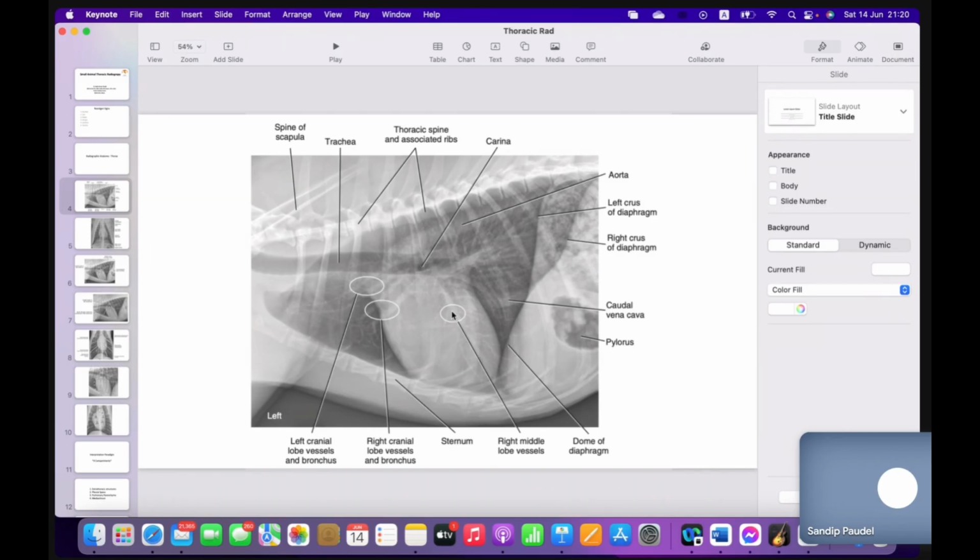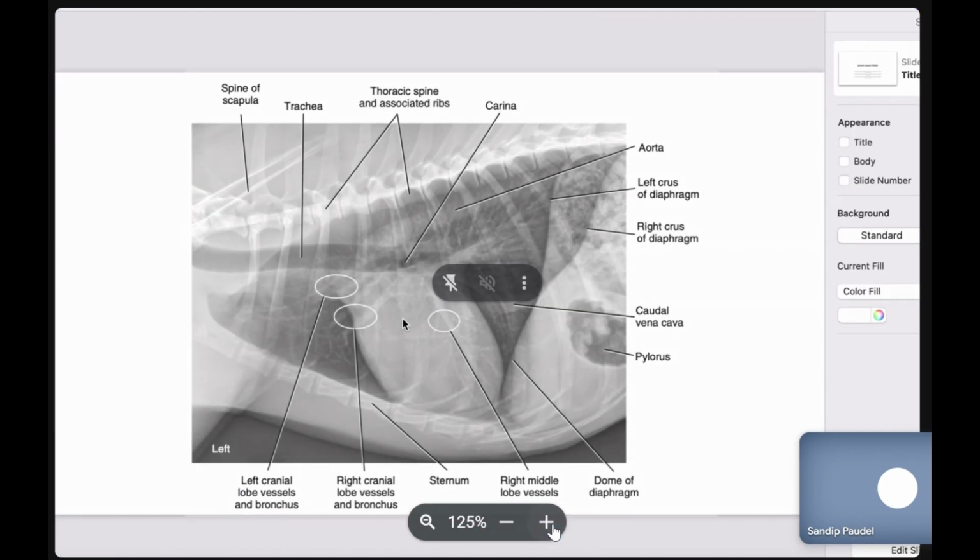And right here, what I want you all to understand is, we are looking at this image. Normally we just see a black area and a white area of heart and aorta and all. But if we really look deep, we can understand there are a lot of vessels going around.